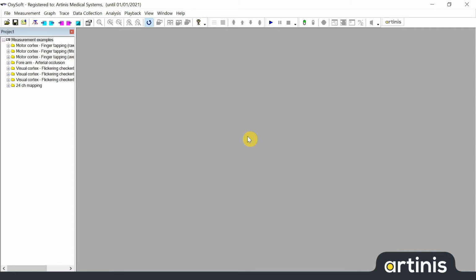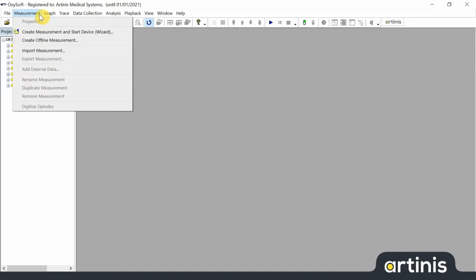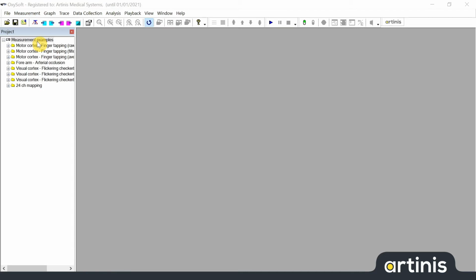In this video I will show you how to import an Oxy file into Oxysoft. After you downloaded your data from an offline measurement, you want to open this data into Oxysoft. Select Measurement, Create Offline Measurement to open any Oxy file.